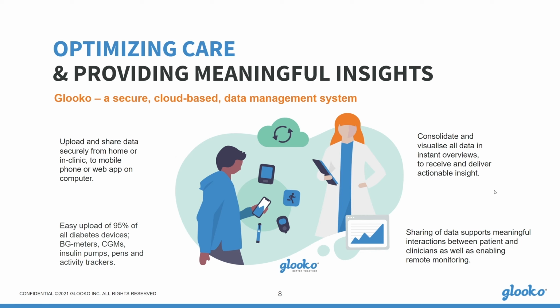We bring all this data together and consolidate it in a variety of reports and charts, which really allow both healthcare professionals and patients to delve deep into the data and gain actionable insights. Now, sharing of the data reports between healthcare professionals and patients really helps to facilitate meaningful interactions between patients and their healthcare professionals, and also helps to enable remote monitoring as well, which just improves clinic efficiencies further.